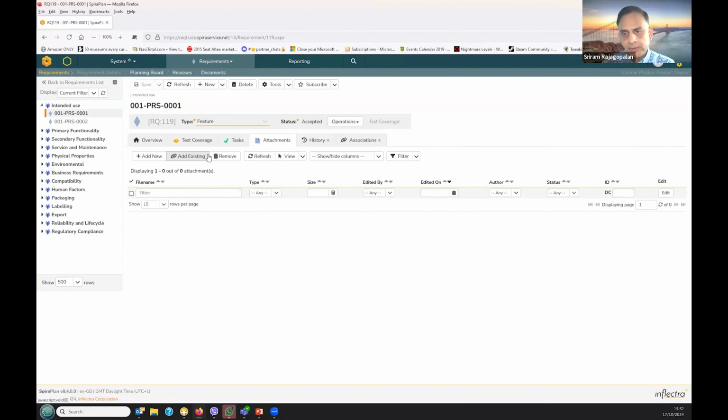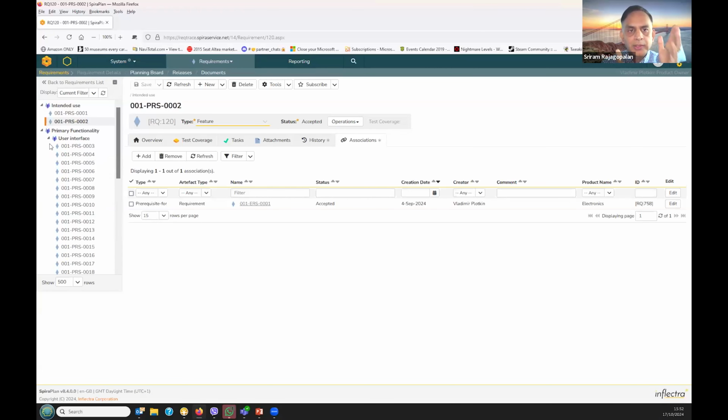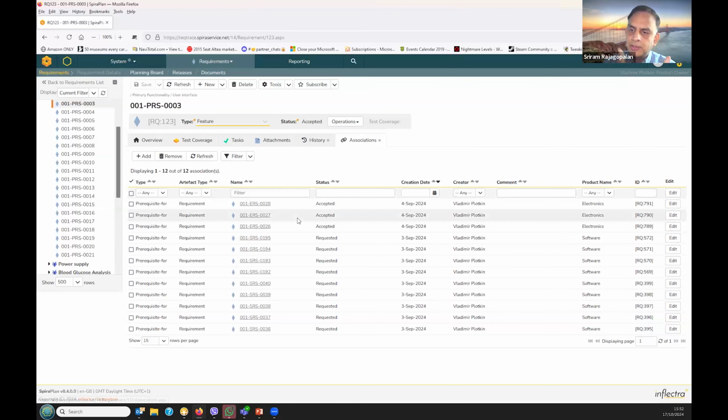If their business operations is that way, that's fine. In that particular case, you would be able to come to the association tab. Vlad is already going there. Right there, you would be able to say, I would like to associate this requirement with 2, 3, 4, 5 requirements as well.